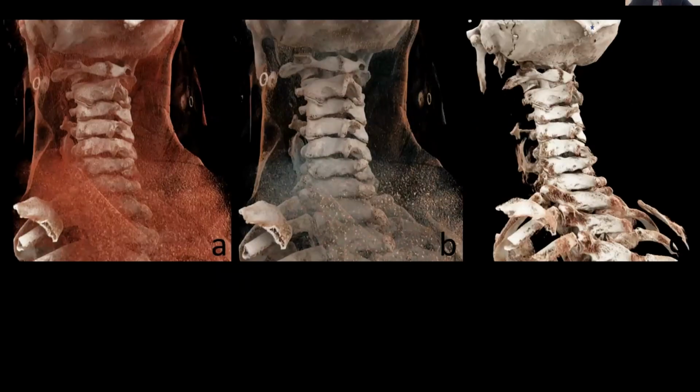Now a corollary to that would be, well, could we use this? Because when you say something's reliable, you kind of have to say reliable for what exactly, right? So if you were planning to use this, and we can go on various tangents, but just briefly, things like augmented reality or virtual reality, or using this as overlays in surgery, if you're looking at robotic surgery with anatomic trajectories to place your instruments, this is not going to be reliable.